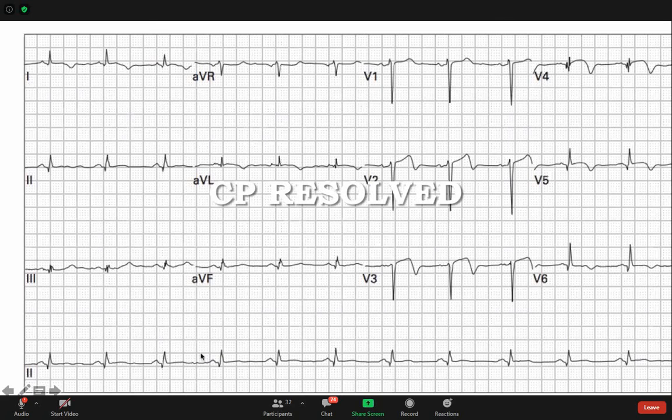والكيو ار اس at the rate of what؟ كم حسبنا الريت؟ قلنا 75. So around 7 squares، بس إذا تحسب يكون 66 so it's fine. لما تحسبها بالار ويف عد 1 2 3 4 5 6 7 8 9 10 11.